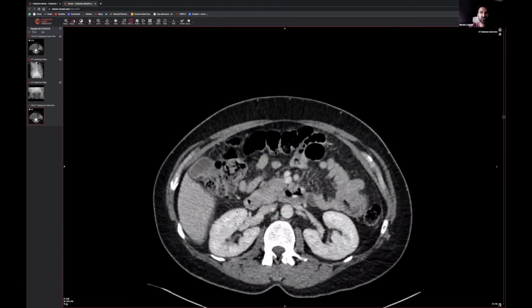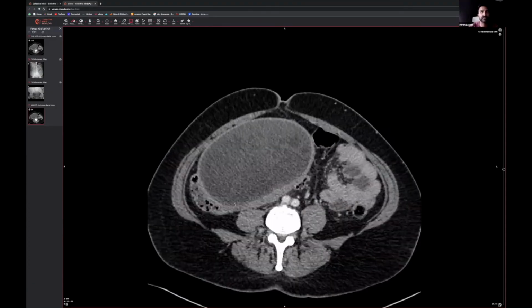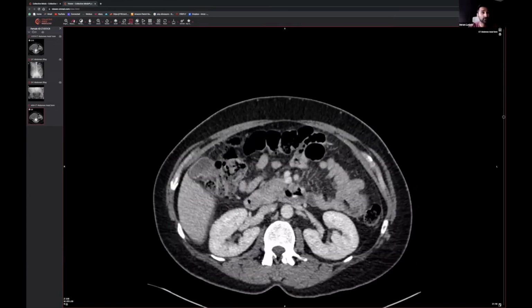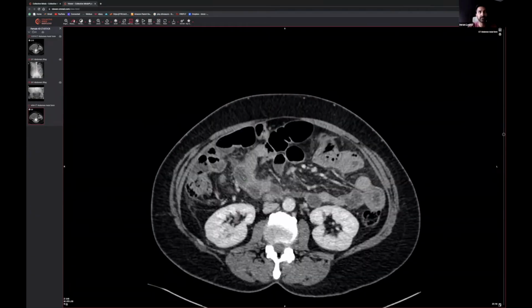And generally speaking, you'd usually want to do a non-contrast study if you're going to be investigating fat infiltration. The gallbladder calculus is there, but it's not causing any abnormalities or any sort of compromise at this present time. So, yeah, well done.